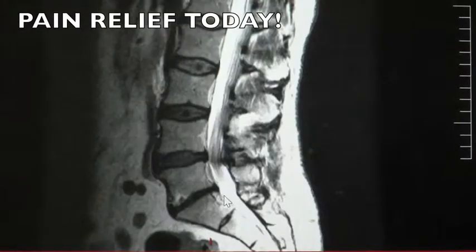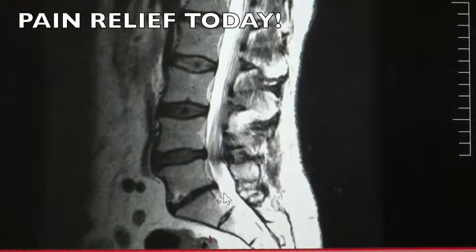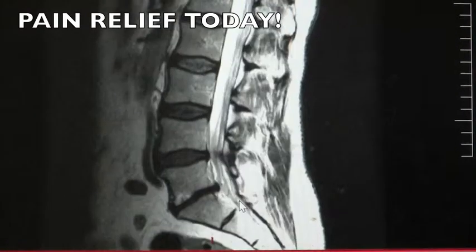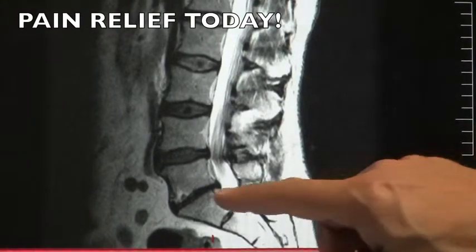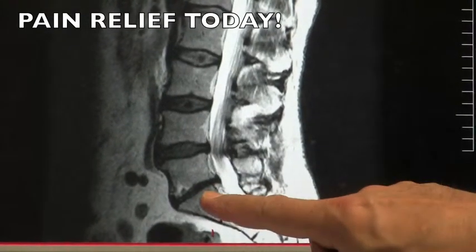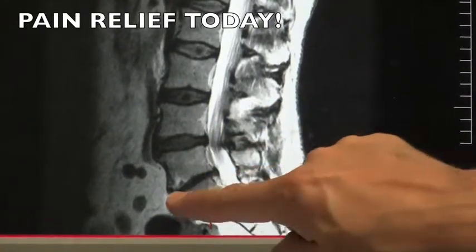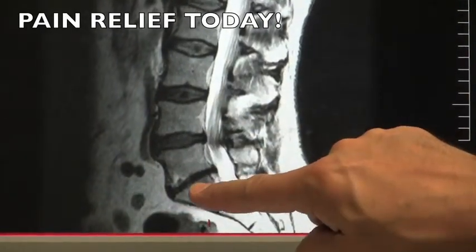In any case, I don't see a lot of degenerative changes in this spine, but I do see some significant degenerative change here that has made this disc much thinner than it should be. It should be similar to that in terms of the height. So that's been compressed and has gotten compressed over the course of decades.